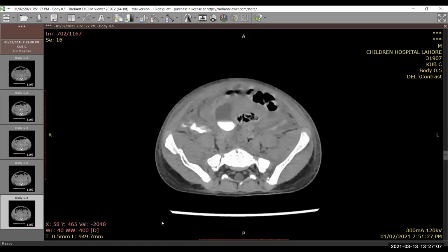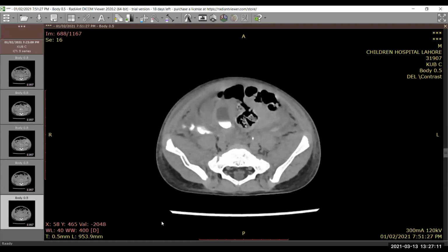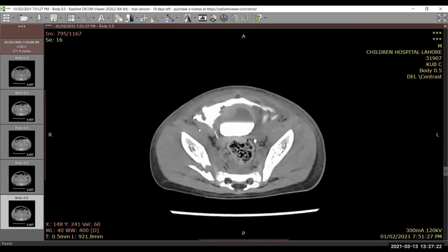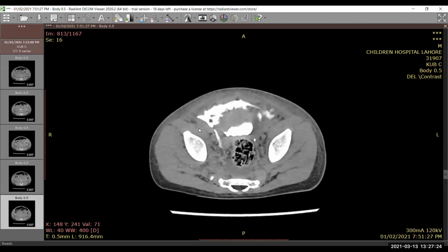Okay, since we'll have to come back to it, I just tell you about it. You are right, there is bladder rupture, but it is a combined bladder rupture. You see this in the right paracolic gutter, which is intraperitoneal fluid. And when the contrast is in the perivesical space, it is extraperitoneal rupture, right? So this was a combined urinary bladder rupture with multiple pelvic fractures. Okay, I was about to tell, but I was not aware of a combined thing.